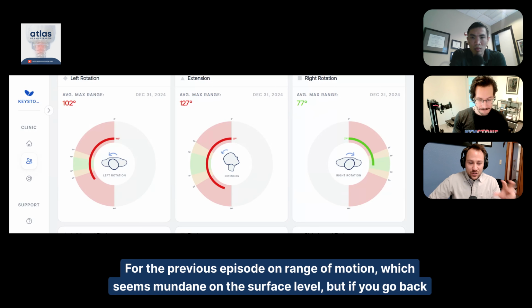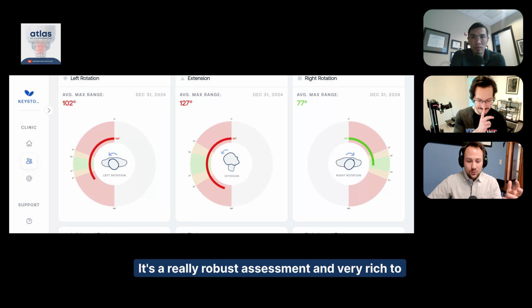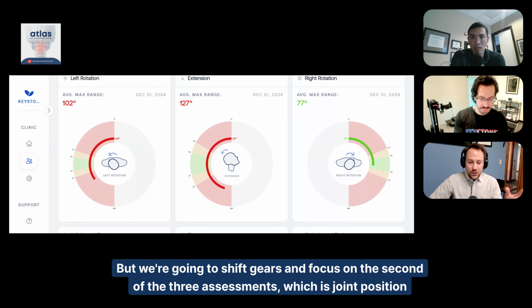For the previous episode on range of motion, which seems mundane on the surface level, if you go back and listen and watch through that conversation, you'll find that there's so much there. It's a really robust assessment and very rich to our understanding of function of the cervical spine. But we're going to shift gears and focus on the second of the three assessments, which is joint position error.